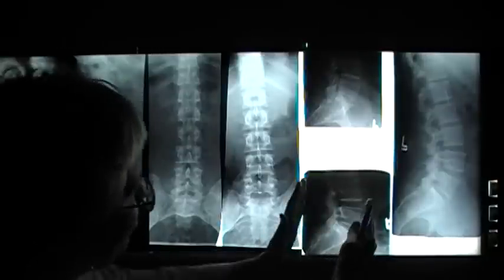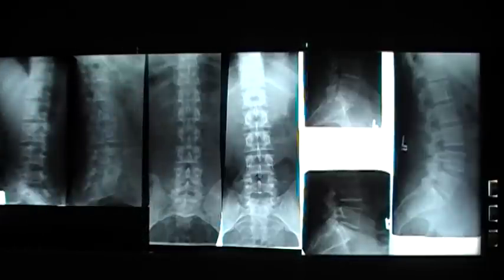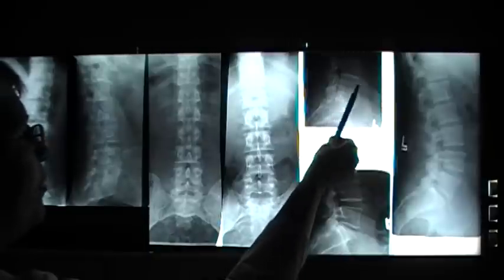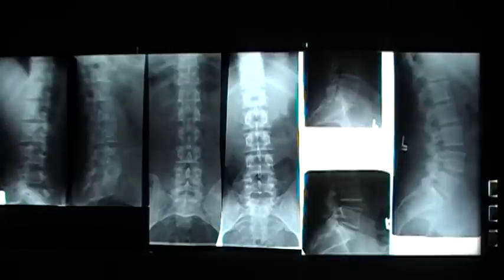So have it open enough to include the spinous process as well. Here we see our intervertebral disc space, here we do not. So do not turn in an image like that to your doctor because they will want another one.